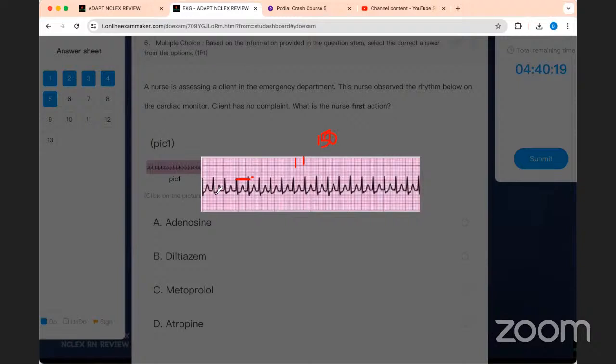And you look at it, I see one, this is T wave or P wave. I can't tell. There's no time for the T wave to even relax. There's no time for the T wave to show itself. So we have a bunch of T and then P together. So you have one wave that is mixed with each other. You don't have like two, like sawtooth that we saw. This one is like only one between them. So you don't know which one is T or P.